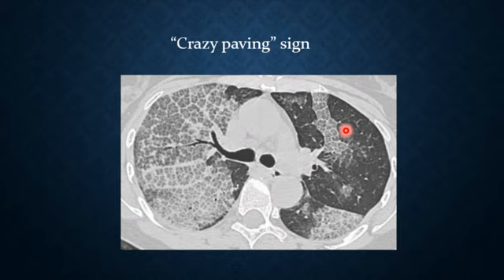Number one, alveolar proteinosis. It is very highly suggestive of alveolar proteinosis. Other differentials? Well, it's more in favor of bronchoalveolar carcinoma or silicosis. PCP infection also can be seen in this, and some others. Lymphangitis carcinomatosis can be put in the differential diagnosis, but it usually does not present with a typical crazy paving appearance. It presents with interstitial, interlobular septal thickening.